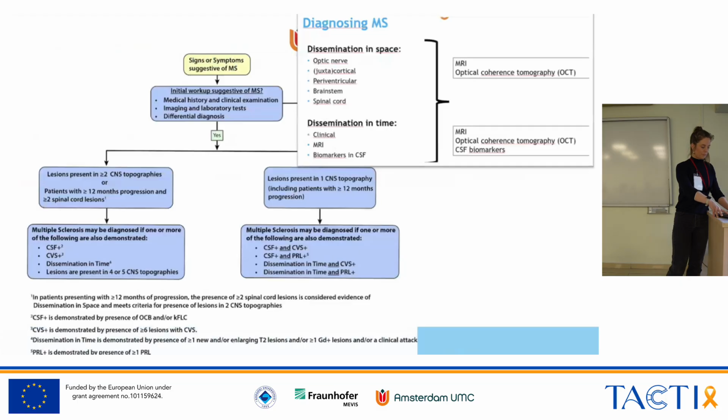And as a reminder, say this patient didn't have any clinical symptoms and you just by chance find this on an MRI scan, for example in a study patient, and incidentally you find these lesions, but there are no clinical symptoms. Until now that was RIS, radiologically isolated syndrome. But according to the new criteria, I can call it MS already, right? It depends on the number of lesions and the number of localizations affected. So I'm not sure.